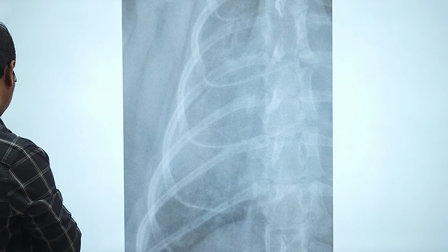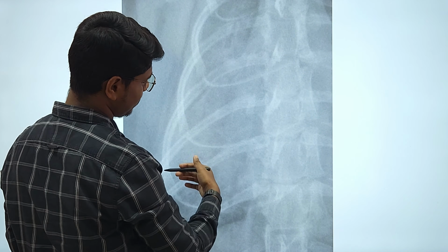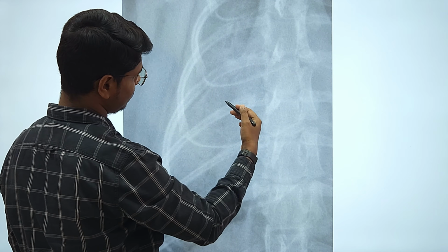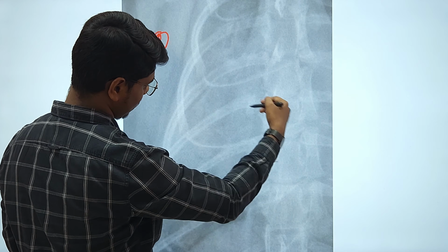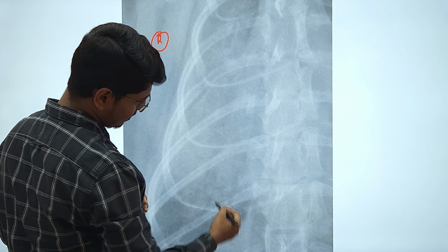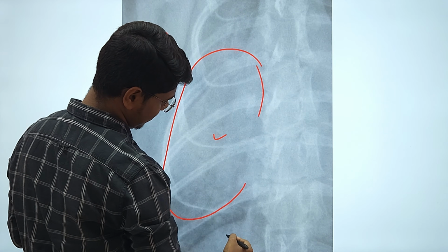This is also another radiograph. You can see the opacity of this particular lobe. Usually the caudal right lobe, this one is right hand side, this is the caudal lobe. So this particular lobe has been affected and you can see the opacity of this particular region is the same as that of the diaphragm here.